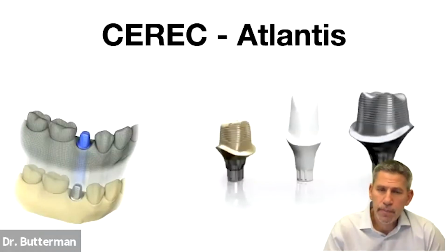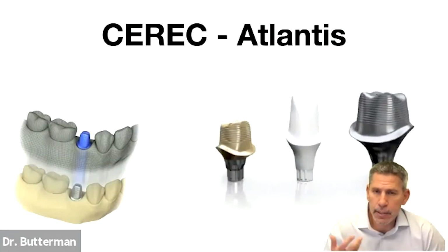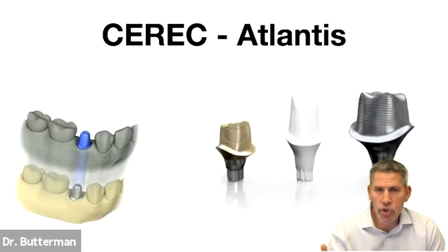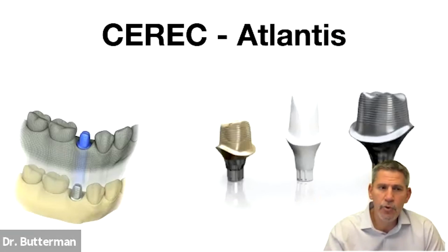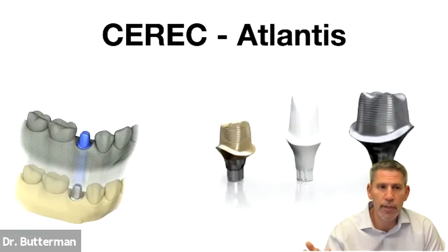So how do I restore it? The implant's been placed. We've already done this fantastic digital workthrough, from the prosthetic planning of the implant all the way through to the surgical planning, and then the execution of it surgically. Well, how do we maintain and keep that digital workflow, and how are we going to be able to restore it?